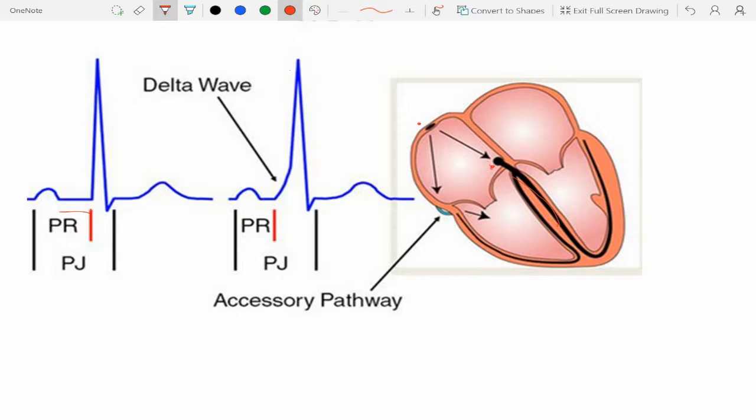Everything rapidly through the same system to both ventricles, and therefore you don't take a lot of time to activate the ventricles, and it's fast conduction, so your QRS is narrow. Okay. Now when you take out the AV node, either by giving adenosine or ablating the AV node, which you don't normally do, all you are left with is a pathway, then you would see a very fully pre-excited QRS. Okay. Now you don't get a chance to see that because the AV node starts conducting. After a while, it does allow the impulses to travel into the myocardium. Got it. So somewhere around this point, there is conduction through the His-Purkinje system, and the QRS starts to narrow. But until that happens, you're able to see that nice delta wave.